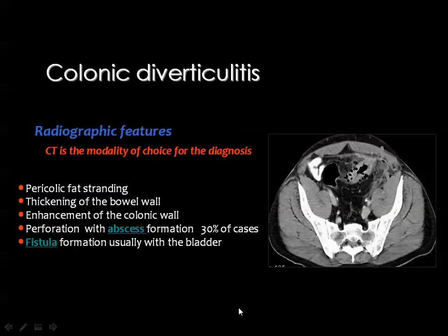Then the easiest way for the diagnosis of diverticulitis is through the CT scan, where you can see the affected segment of the colon has a relatively thick wall, and the pericolic fat is smudged or stranded by congestion and inflammation. Meanwhile, you should identify some of the diverticulae as buckets filled with air in the affected segment of the colon.